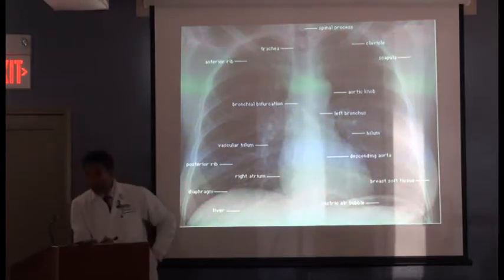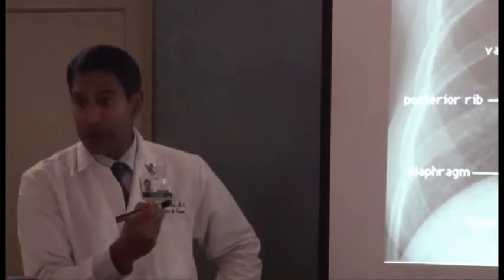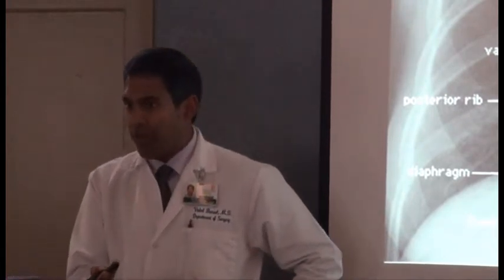Now, if it was black, Wendy, what do you think that could be? It's totally black. There's no lung here at all. Right, exactly. It's a pneumothorax, right?